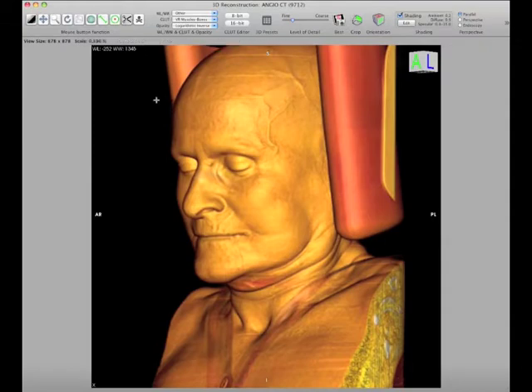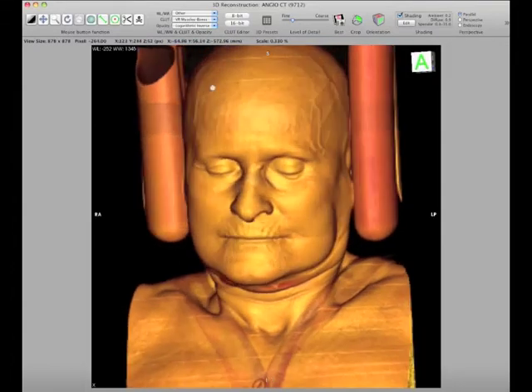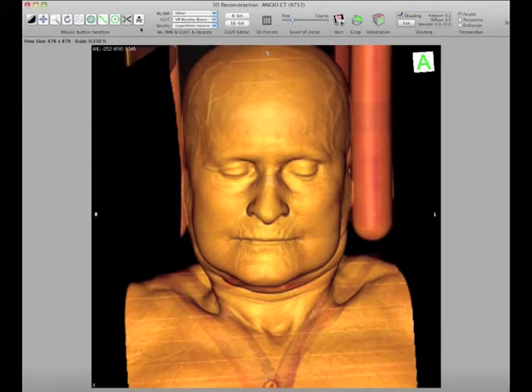This is a scissor tool, so if I wanted to cut something out here, I could go around it like that and hit delete, and it would cut it out. And you can see that's cut out in space, right? So you could cut these out like this. Delete.